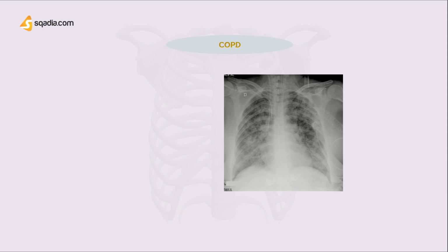Now, if COPD is suspected, we're looking for the following features. A pneumothorax, which is common in COPD, so we have to look for these since they can hide in the lung apexes. We're also looking for a mass lesion or metastasis or any other sign of lung cancer. A history of smoking is almost universal in COPD, so look for evidence of bronchial carcinoma.